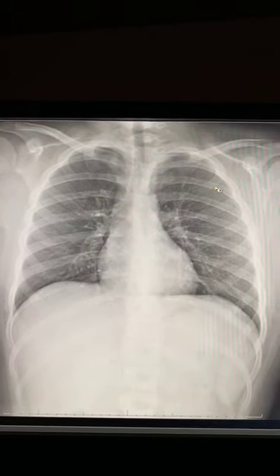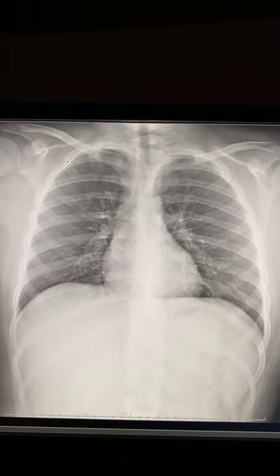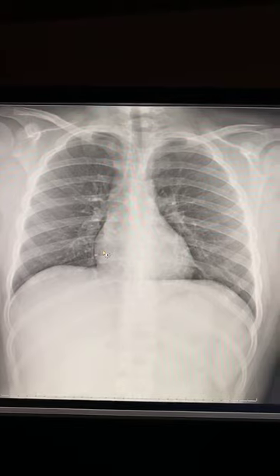But if you see very little of the scapula and the scapula is actually way back here and the shadow's all the way over here and the shadow's all the way over there, then it's probably a PA view. The patient's got his arms nicely rotated for you and everything looks pretty good.